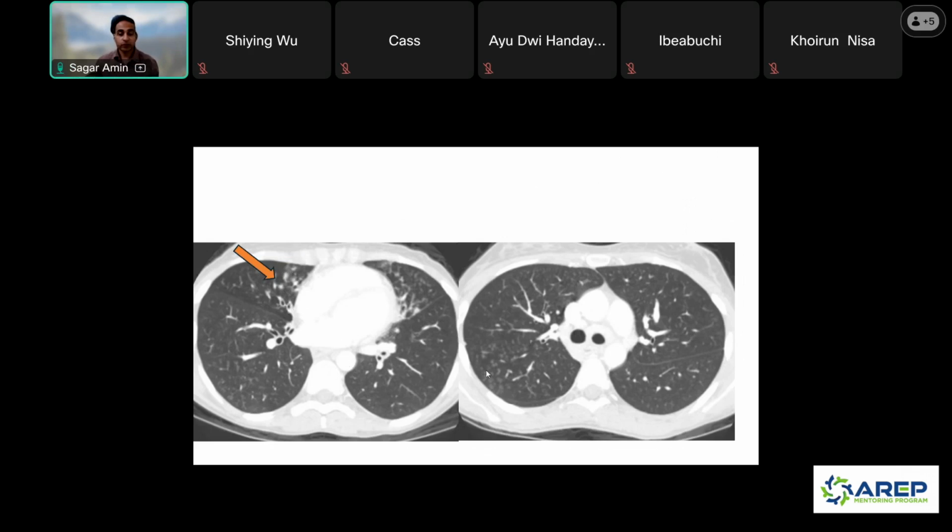And if you look down in the lower lobe here, you'll notice that these centrilobular nodules are branching out. So this is an example of a tree-in-bud nodule pattern. All this means is that there's inflammation at the level of the airway, in this case at the center of the secondary pulmonary lobules and the more branching, smaller airways.